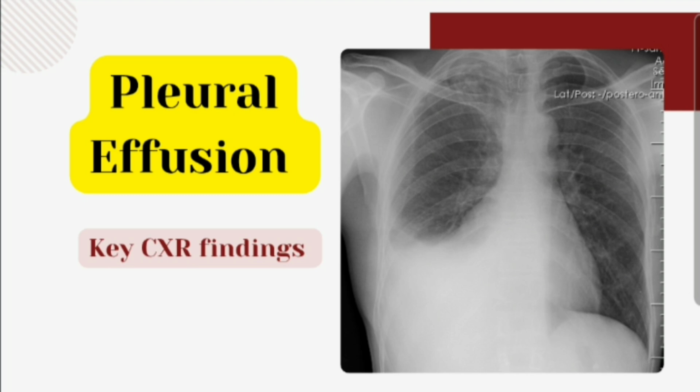No air bronchogram is seen which supports the diagnosis of pleural effusion rather than consolidation. Cardiac silhouette is preserved and there is no mediastinal shift. Left lung appears clear. Also, there is no evidence of bony abnormalities and soft tissue appear unremarkable. So, my findings are consistent with the diagnosis of right-sided pleural effusion.